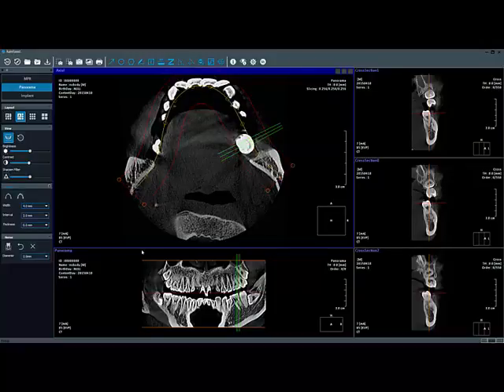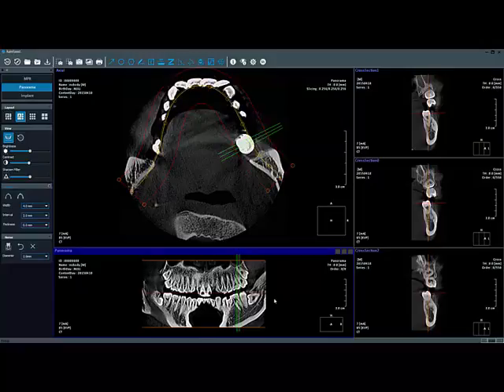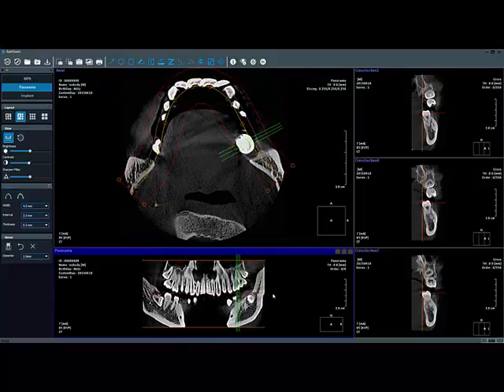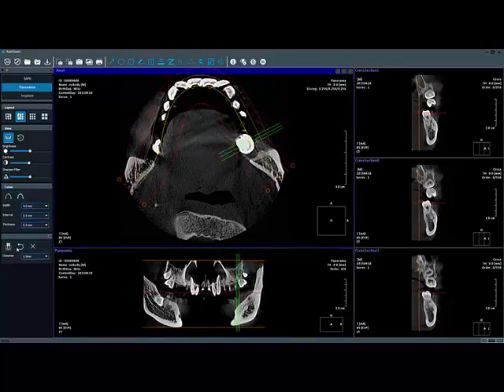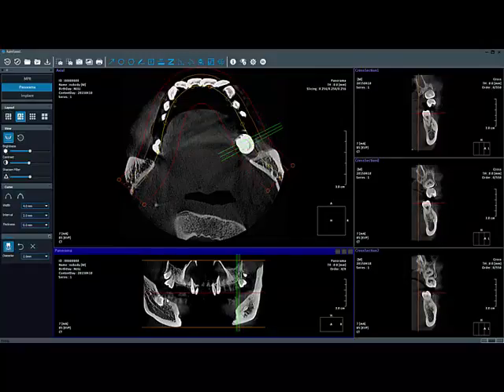Now choose the best layout or the window which is easy for you to use and start tracing the nerve pathway. Now click on the nerve and start with a left click on your mouse along the nerve pathway. So when you're finished, right click on your mouse.